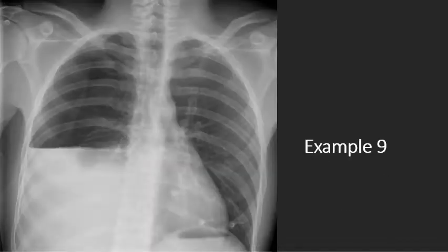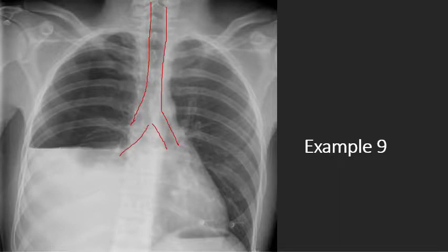So let's look at this one. Man, what is going on here? So we look over here, we have our airway. Here's our trachea coming down over here. All right, pretty deep, it's a deep little airway here. No midline deviation. Looking at our bones, no bony breaks. Here you see your electrodes. Okay, there's an electrode right there on his right humeral head. Moving on, we don't see any lung markings because they stop right there.